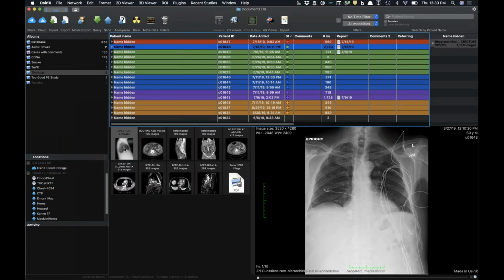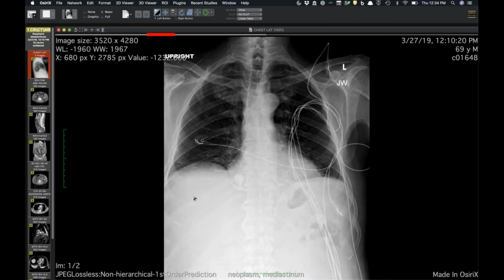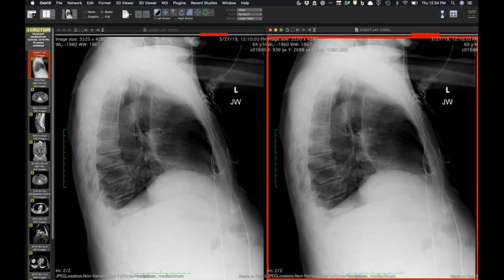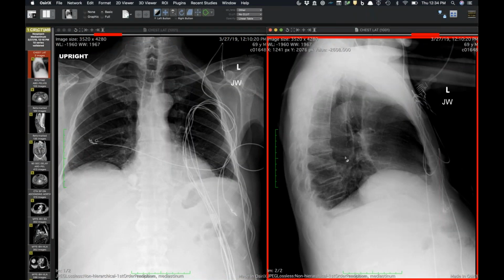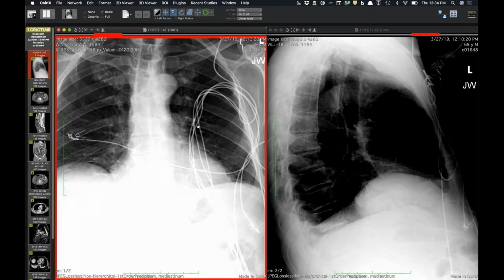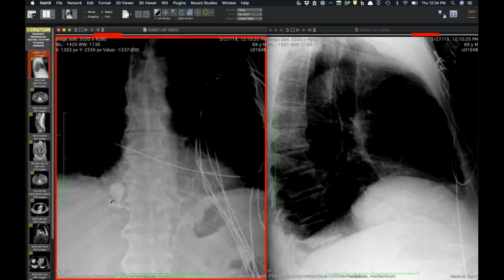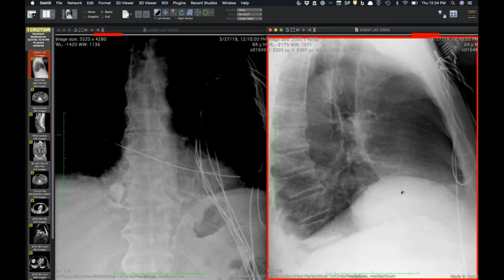All right, so back up to the top here. A few of these have interesting radiographs. This is a 69-year-old man who was presenting with weight loss, dyspnea, gradual worsening of lower extremity swelling, abdominal bloating, etc. And let's see if I can unsync these. And you can see that he's got an interesting finding when you zoom in on the heart, or at least on the mediastinum. He's got this very coarse calcification, and you can see it on the lateral view as well.